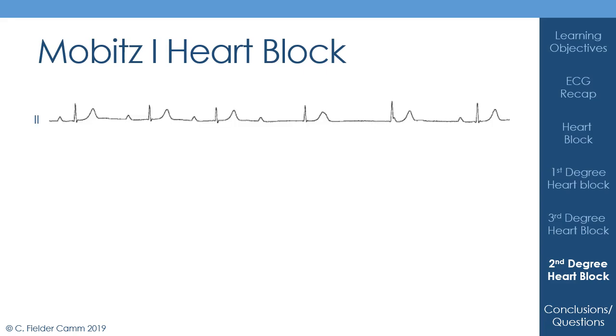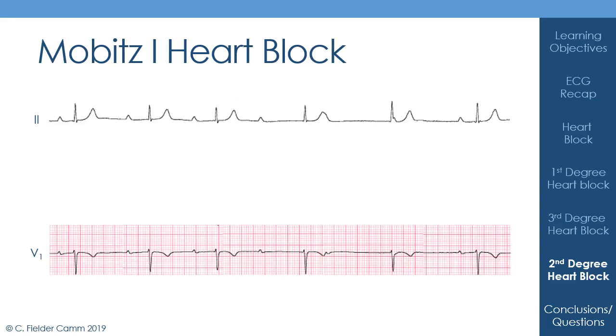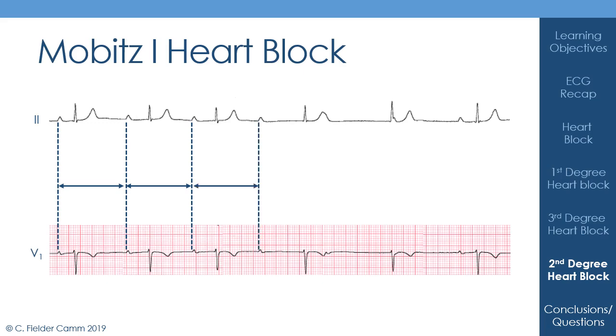Okay, so here we've got an ECG trace. And I've got the same ECG trace actually below here on a slightly different piece of paper, but it is actually the same trace. And you can see they're regular P waves, okay? So I'm going to map those out. You can see them here, and they're regular, right? So the gap between them is the same each time.